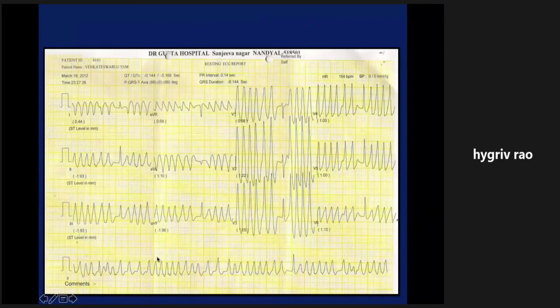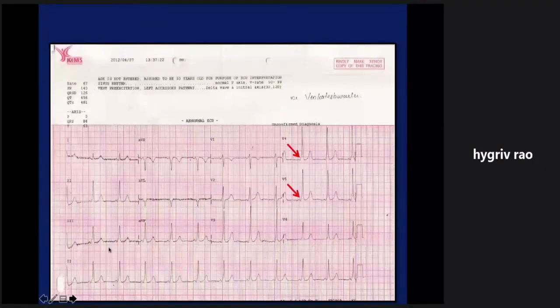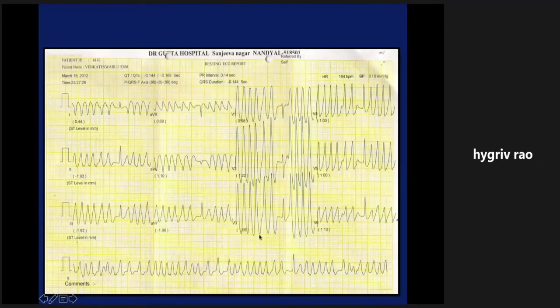Look at this. Now, you have a tachycardia like this. Again, if you remember, I showed you a polymorphic ventricular tachycardia with a wide irregular rhythm. Now, look at this tachycardia. Here the QRS complexes are fairly well formed. They are not unformed or like electrical disturbances, but they are irregular. So this kind of wide QRS irregular tachycardia is always considered pre-excitation.